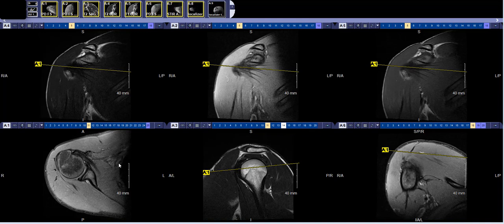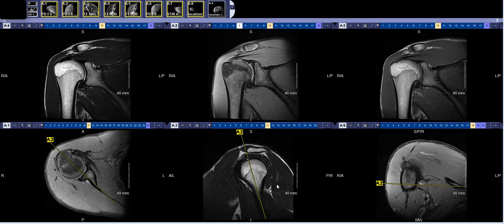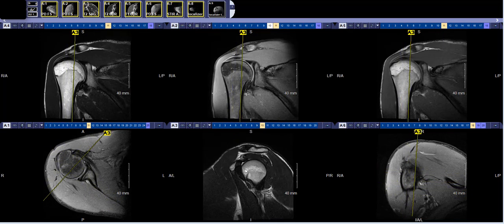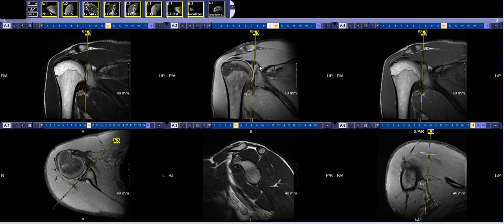After the rotator cuff tendons and muscles of the rotator cuff, I move on to the glenohumeral joint, structures within and that traverse the actual joint. And I typically start just characterizing joint fluid, so give a subjective analysis of how much fluid is in the joint. Don't forget to look, fluid tends to like to accumulate in what's called the subscapularis recess here anteriorly, which you can get a good idea on the sagittal sequence, how much fluid is in that recess. But this is essentially a physiologic or normal amount of fluid in this joint.